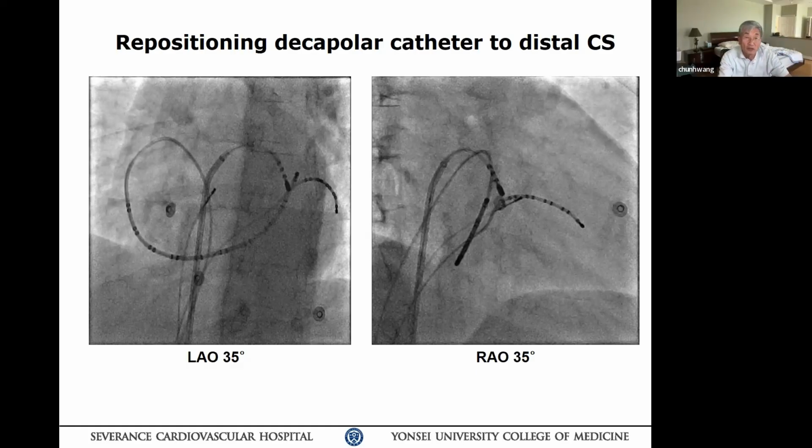Yeah, I think there are two issues. LV pacing certainly favors the pathway conduction. That still would not exclude the possibility that the patient has double tachycardia, because you're going to advance it. The question is how do you reset it, or whether the HH interval varies, and so on. So if you paced the right ventricular base or LV, I think it would be a much clearer view rather than pacing the right bundle.